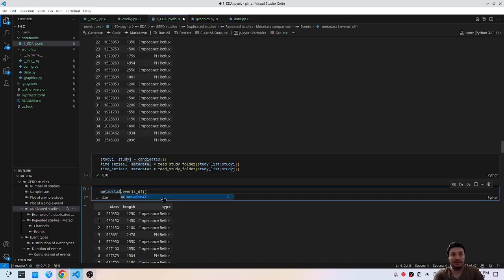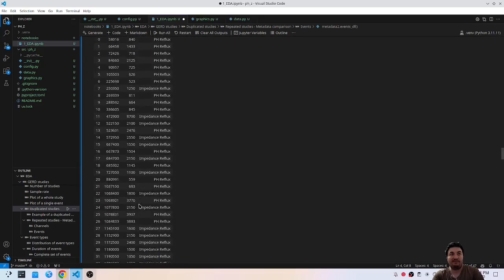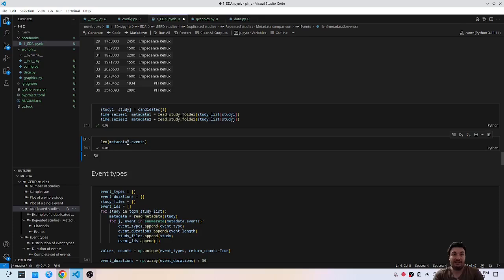We have a few ones, and we have, why on earth is this the case? I have no idea. 58, 44. It's the same data.